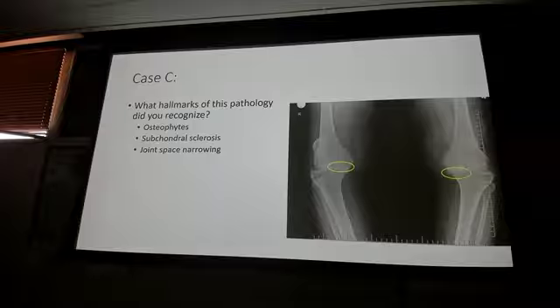The bones are already captured. And the meniscus are still there. Have they torn them? Maybe. There might be some small tears in there. I don't know. But yeah, no, they're still there. It's the cartilage that actually wears down and goes away in prolonged arthritis. But you can't see that on X-ray either. So we just focus on what we can see in this course for right now.